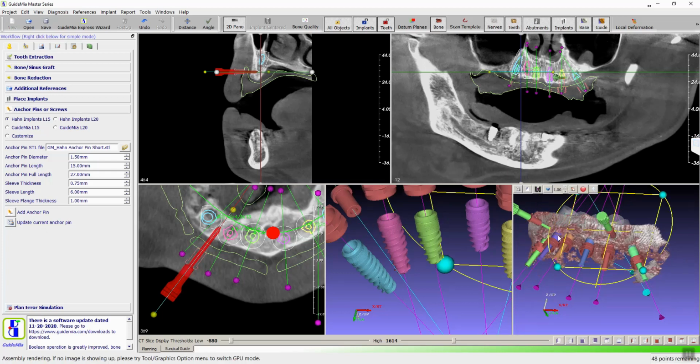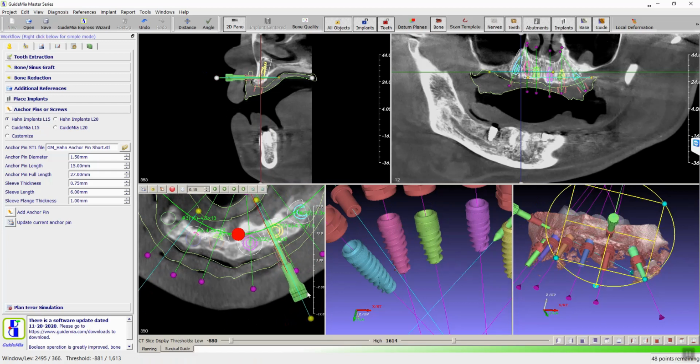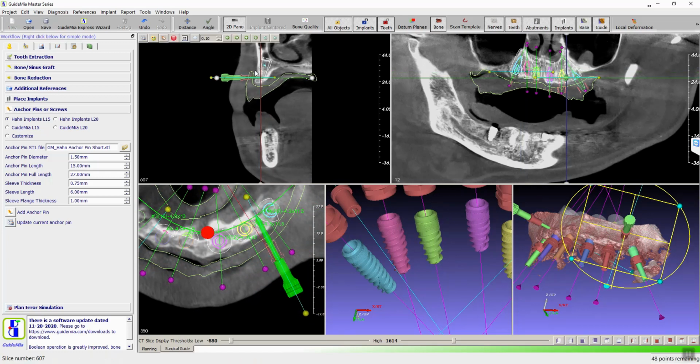The bone guides fit pretty tight. You mean the models you printed last time? Yes. Yeah, it fits nice and snug. We did not get a chance to try it on the patient, unfortunately. Yeah. So let's check this. All right. So maybe we'll just leave it with this now.